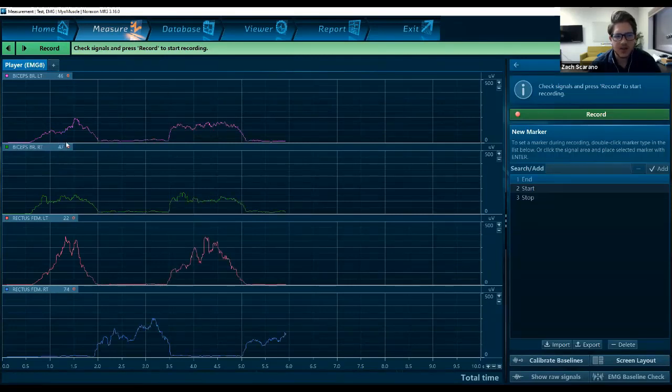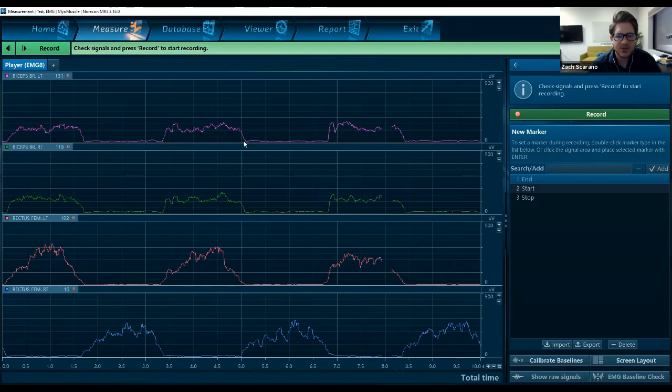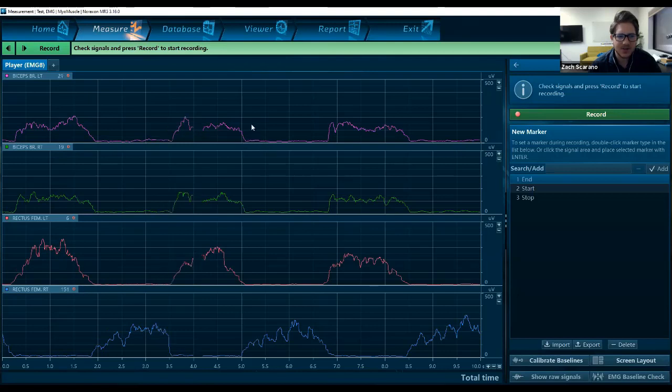The other thing though is that you can see the other processing techniques applied. So this is going to be that high pass filter as well as that smoothing window. And one thing to note about the smoothing window is I did use an RMS filter, and that actually automatically rectifies the signal. So that's why we still see these rectified signals here.